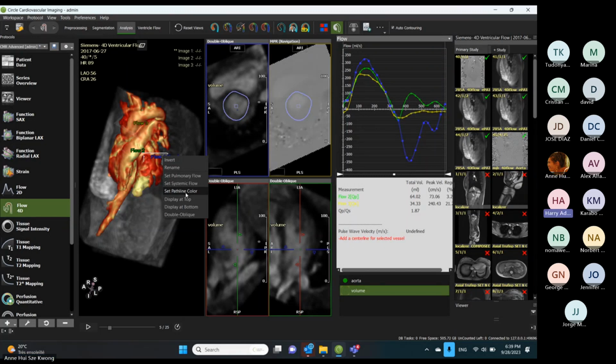Okay. So one more question. I was not in the previous class, but I see the software also has the capability of giving you something like a graph to quantify your images in terms of numbers. I see this graph at my left hand that shows the. So which graph are you talking about? The one with green, blue, and yellow.